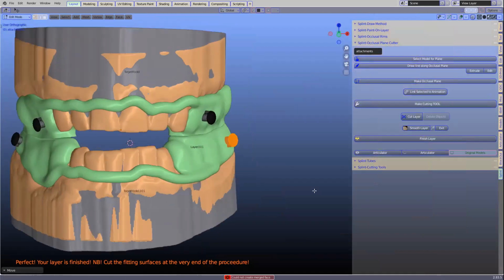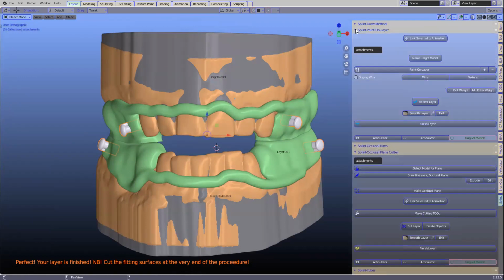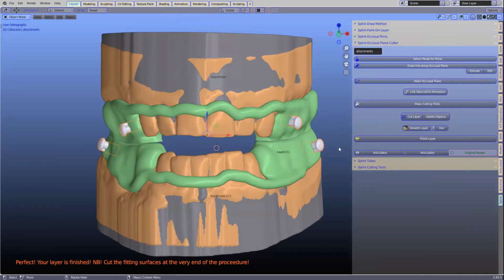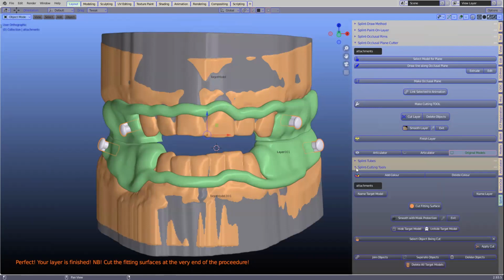The next step is we need to unify these to our individual splints. But at the moment I can't because they are all linked up into one object. So again, I can split them by going to the model designer or looking for a separate button. The separate buttons all do the same thing when you can find one. There's not that many in the actual splint one.